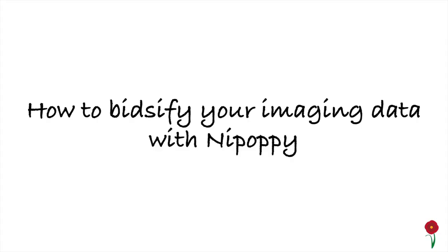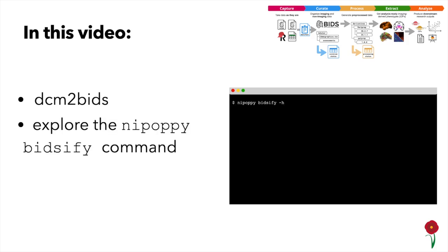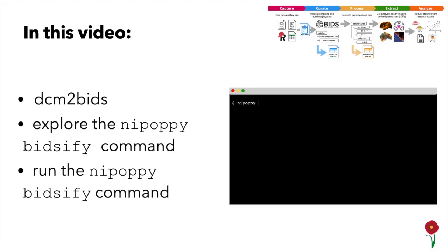Hi, and welcome to this Nipoppy tutorial. In this tutorial, we will cover how to convert our imaging data to the BIDS format. More concretely, we will install the pipeline setup for the dcm2bids software, explore the Nipoppy bidsify command, and run it on our imaging source data.